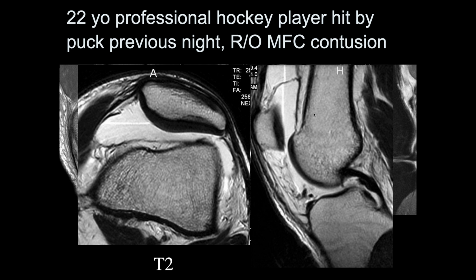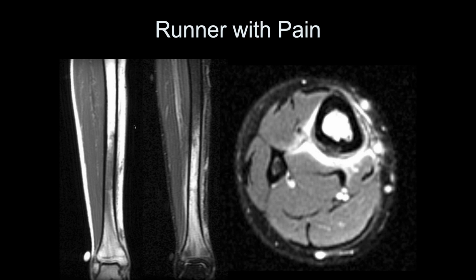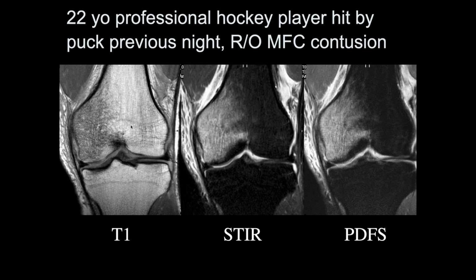There is a fluid level, so I'd be afraid that that's got to be like hemarthrosis. So there's got to be a fracture, like kind of open fracture to the marrow somewhere, because there's fat in the joint effusion. Yeah. So this was a fracture, and we never could quite see where the fracture line was. But there has to be something.